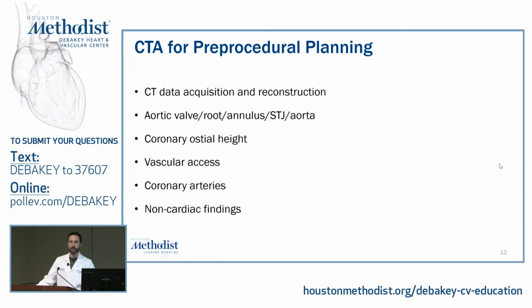So the topic of my presentation today is how to use CTA for pre-procedural planning for TAVR. So here's the outline of my presentation. We'll start with what CTA data acquisition we use and the reconstruction that we use to do all these measurements.